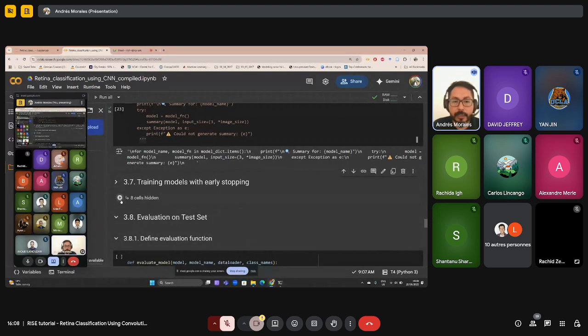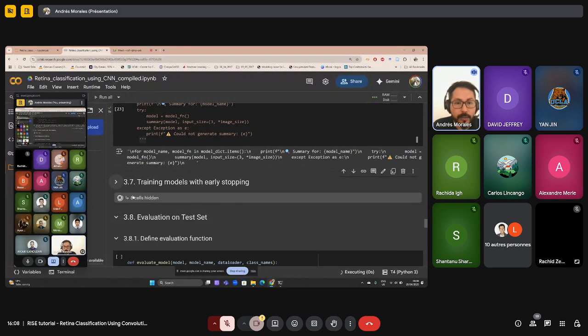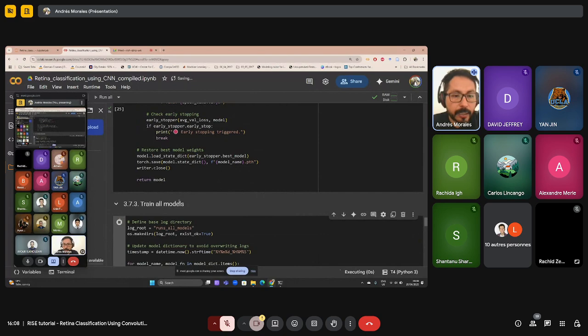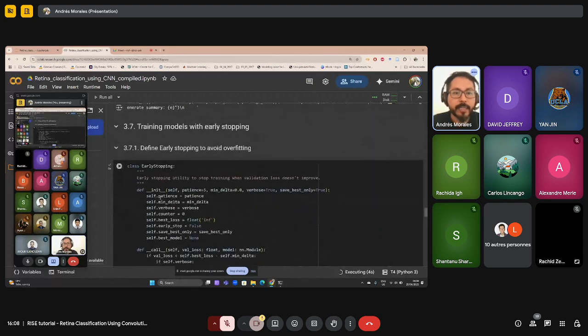And we go to the training part. That's the part that takes the most time. So I'm running this in advance, so that while I explain the code, it is already training and we gain some time.